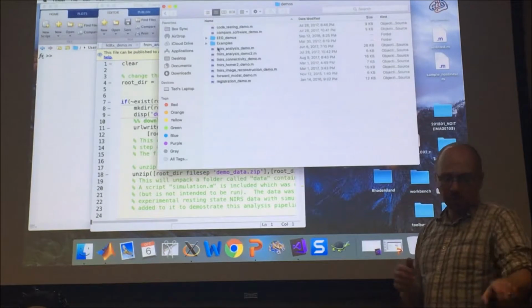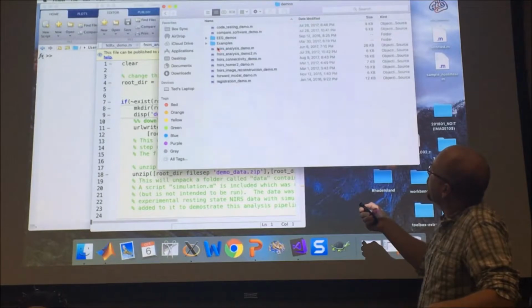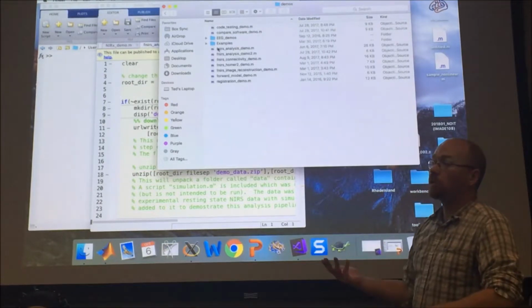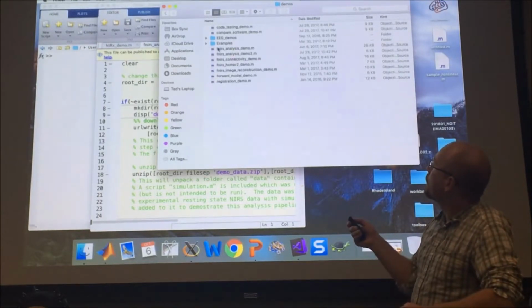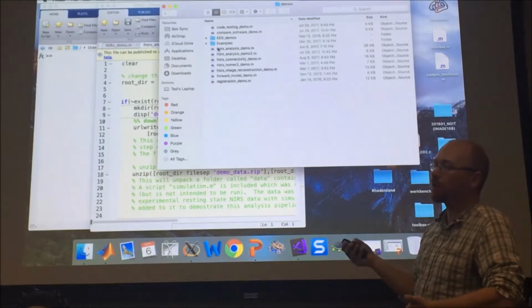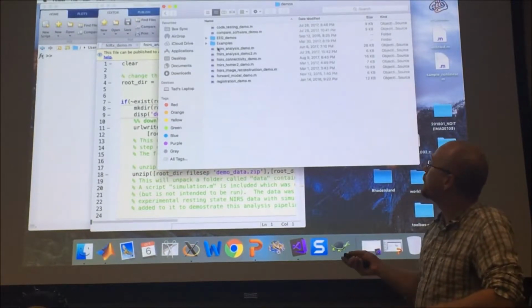So, where's my laser pointer? If you're just starting to look, this one that's covered up by my mouse cursor here, called NIRS analysis demo, is probably the one to start with. That one shows all the basics and the stuff that I'm about to show here with the toolbox. Most of those slides that I presented right before lunch were screen grabs from that demo. It goes through how you load data, how you look at the stimulus information, how you change things like demographics, and then run a first and second level statistical model to look at your brain activity.